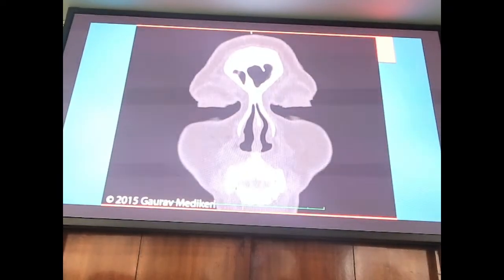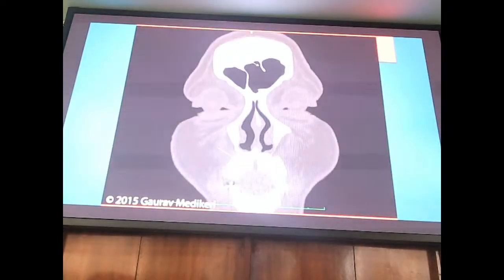You can start to see now the part of the maxillary crest has started to appear there. So, how do we know this is the maxillary crest? Adjoining that area, you will see that there are no teeth, but you will see the palatine process there. You can also see a canal here. This is basically the canal for the anterior and middle superior alveolar nerves.